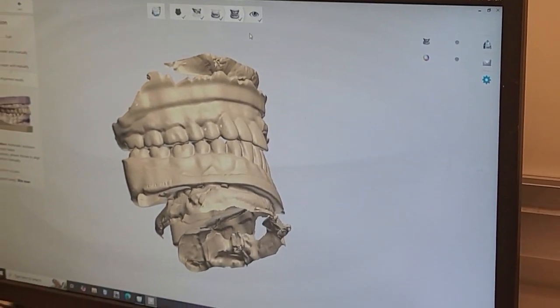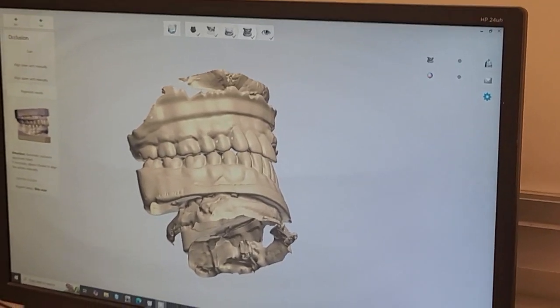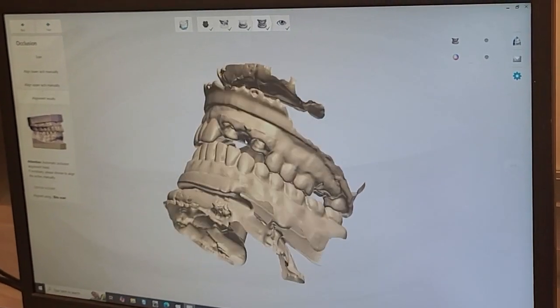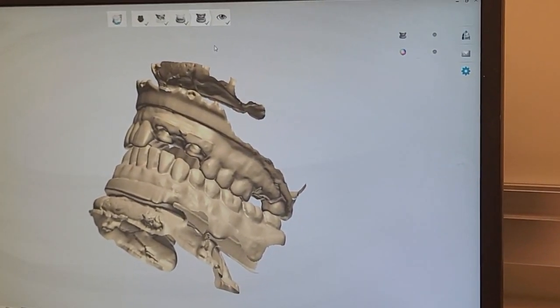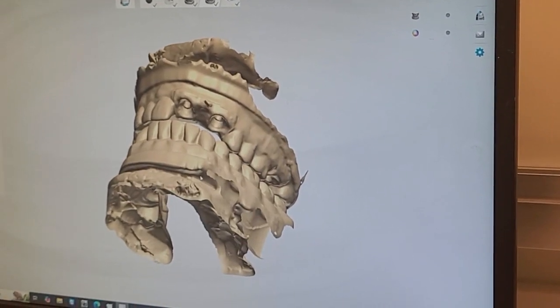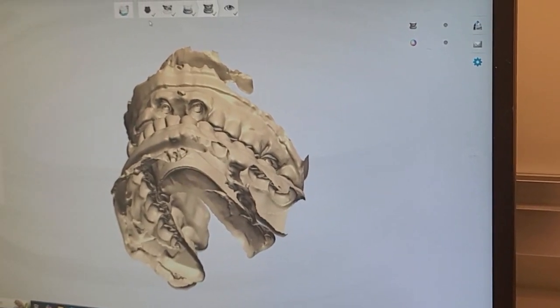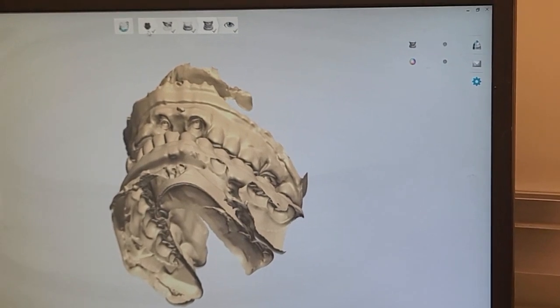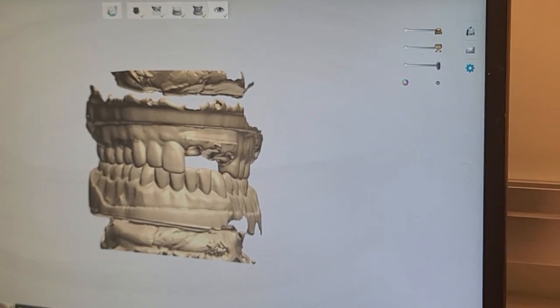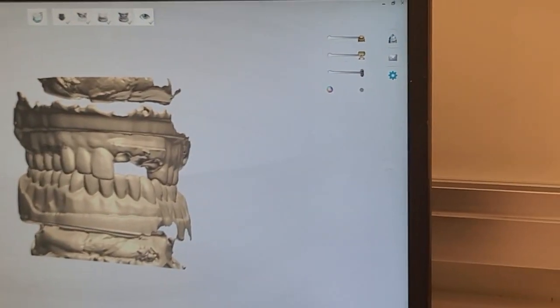So the last step is what it says, to inspect, or to kind of do exactly what I did now. I turn it around and I look to see if everything is correct. If we skip the step, it's not gonna save your order, okay? So always, even if you know it's good, you just have to look at it. Just put your cursor there, move it a little bit, it's fine. You're gonna move it on. So you see all my little steps here are good to go. And now it's gonna send me into the design mode, okay? So we can go into the design.